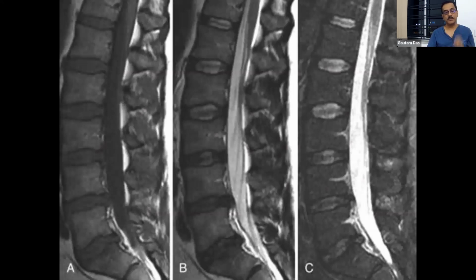Okay, so this is another. This is your T1. I have given a lot of images. Not all images are looking the same. That's why I have given them. So this is also here. See, this is your T1. Epidural fat looks white. You can see here. This is T2. Epidural fat as well as the CSF is looking white, and your disc material also having water is looking white. And this is your STIR, where the water, disc water, nucleus pulposus, and disc here is looking white. So you see, some discs are looking white, some discs are looking black.